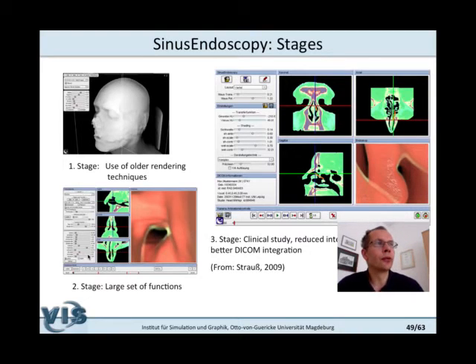If you try to satisfy everybody, you get a larger set of UI controls, which at some point is not good because it can be overwhelming, and then it's difficult for the users to cope with it. So that became obvious after we evaluated this prototype. Here we have overdone it. We just provided too many options to specify the visual effects in detail.